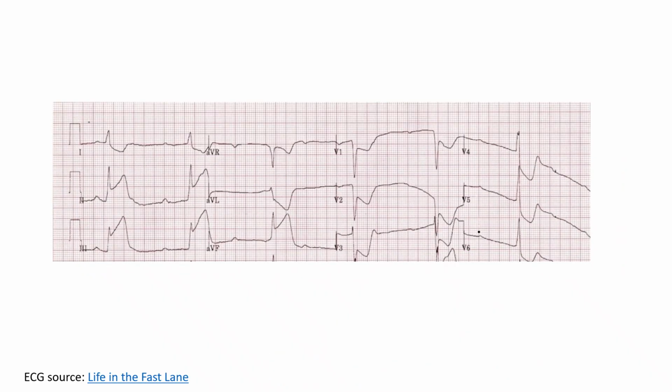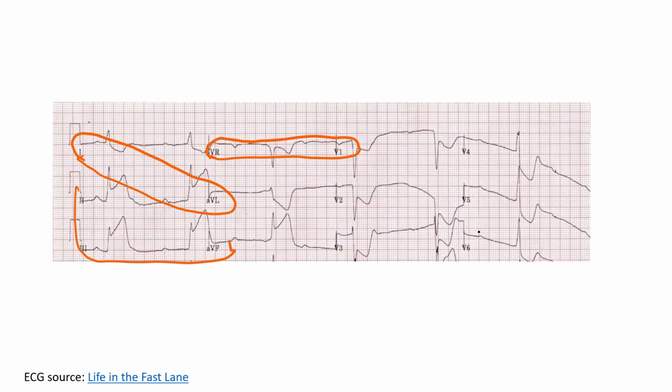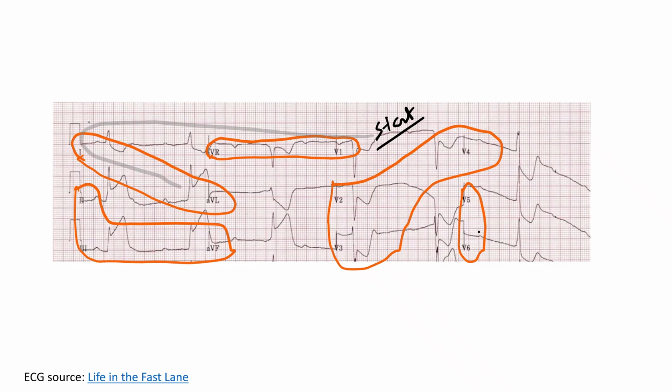After addressing whether the rhythm is sinus, we then address the ischemia question. I start with V1 and AVR first, the right-sided leads, then go left to right in distributions. 1 in AVL for high lateral, 2, 3 in AVF for inferior, and I look at the precordial leads in order. As I look at these leads, I answer the question of whether I'm seeing elevations or repolarization abnormalities that could represent reciprocals or otherwise indicate active occlusion.